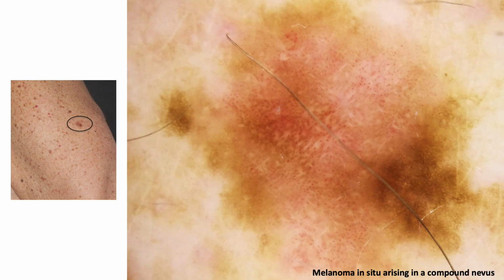Here's a moley individual, right? Many nevi, lentigines, ugly duckling lesion. In addition to atypical pigment network, you see a good example, negative network through the lesion.